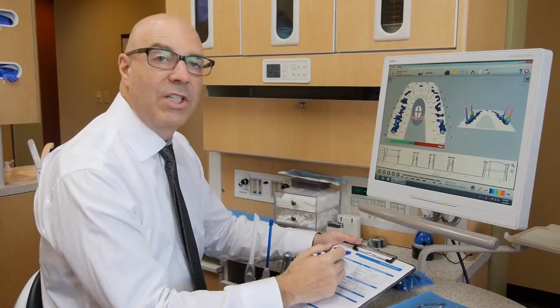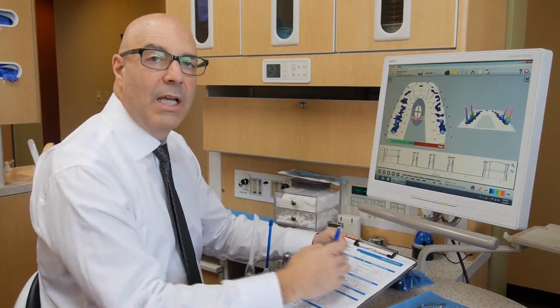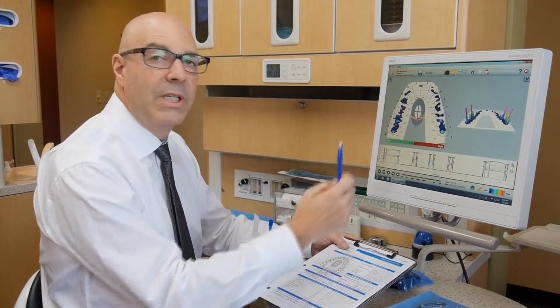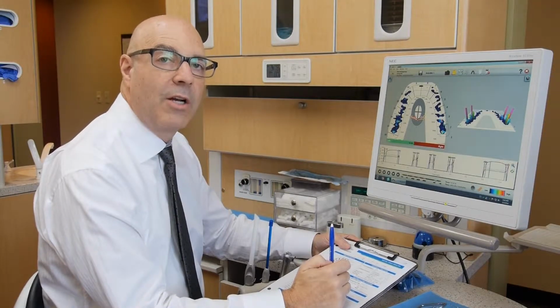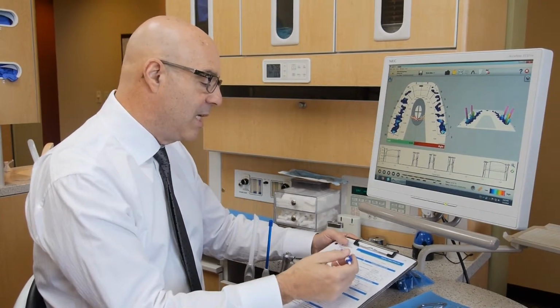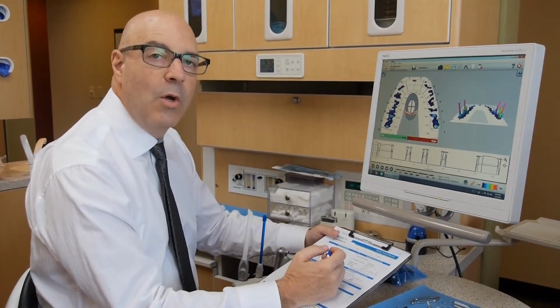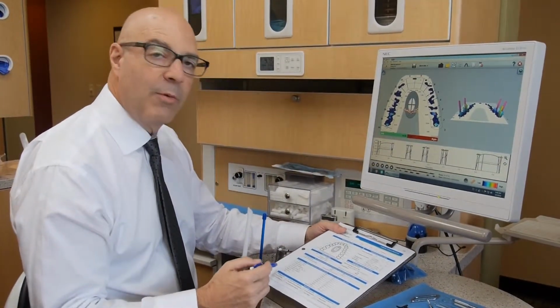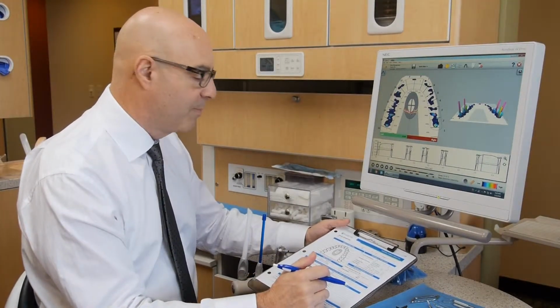The first section of the dental force analysis is the force distribution that is directly correlated to the TScan habitual force pattern scan that we've done on our patient. As we fill out this force distribution and force balance area, we're going to be looking for 4 separate red flags down at the bottom of our dental force analysis form.